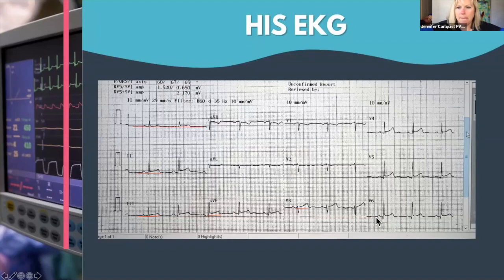Yep. So we're using that TP segment lining up and we're seeing some ST elevation, but it's kind of a widespread picture, okay? And you've got all this ST elevation, but do we have any reciprocal changes? Well, we would normally see ST depression somewhere, but we have no ST depression really.